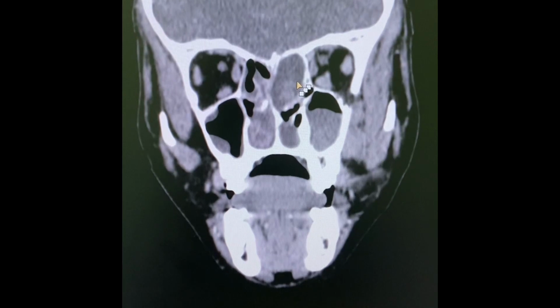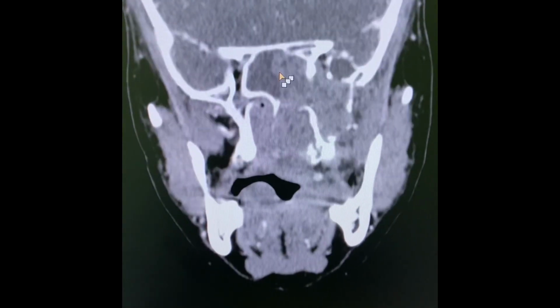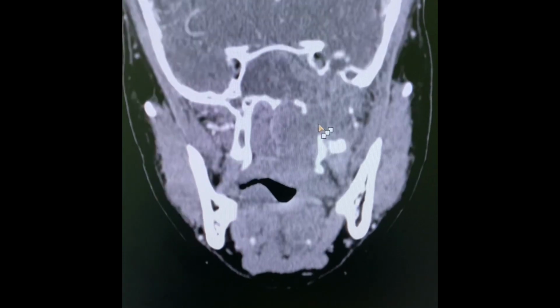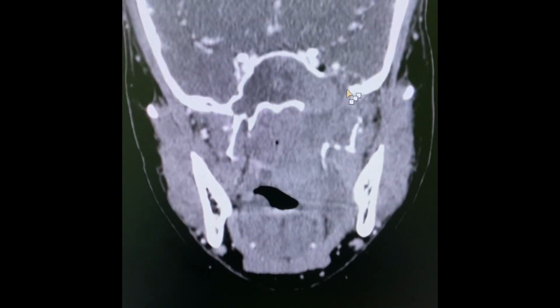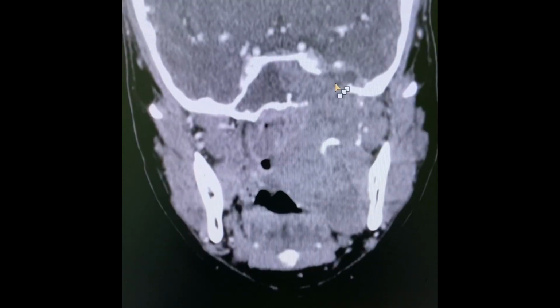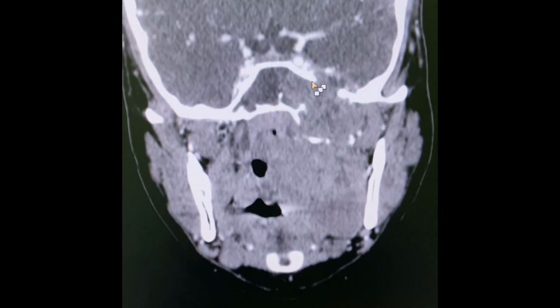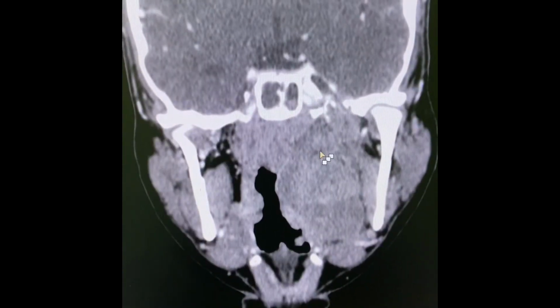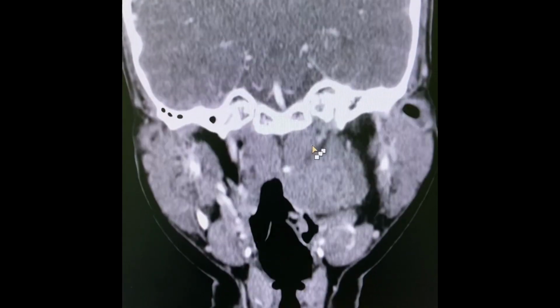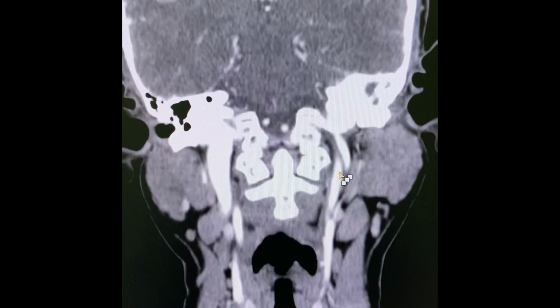This is a CT with contrast of Sridhar Patil showing a tumor in the ethmoid sinuses and going back to involve the sphenoid sinus, entire nasopharynx on both sides, eroding the floor of the middle cranial fossa, that is the greater wing of sphenoid, but no intracranial extension, no intradural extension, as is suggested by the MRI study. It is extending into the parapharyngeal space, infratemporal space, involving the cavernous sinus, but the internal carotid artery is seen here.